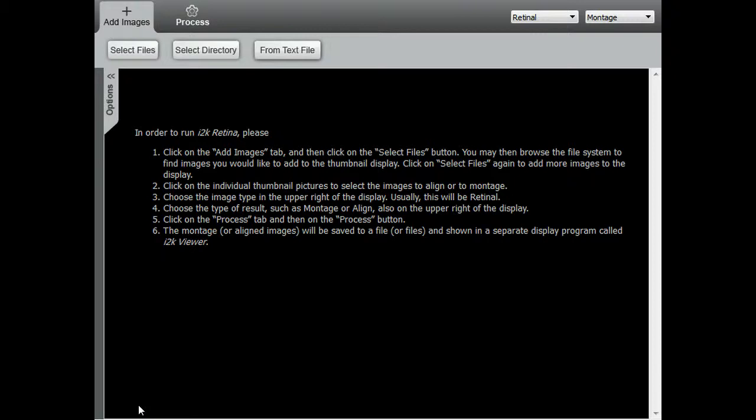the Montage sequence. In other words, the output would be a set of aligned mosaics, as well as the notion of capture groups. We will go through the details in this demo. First of all, let's start loading a set of images.